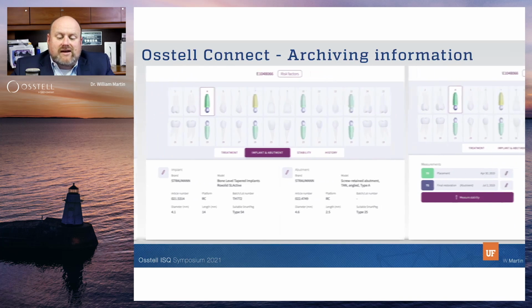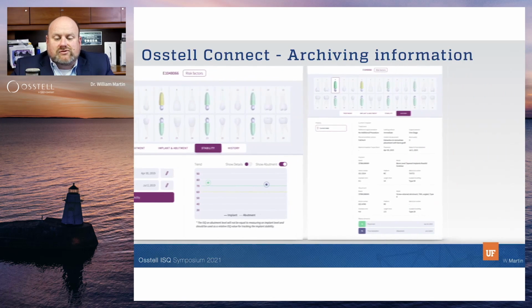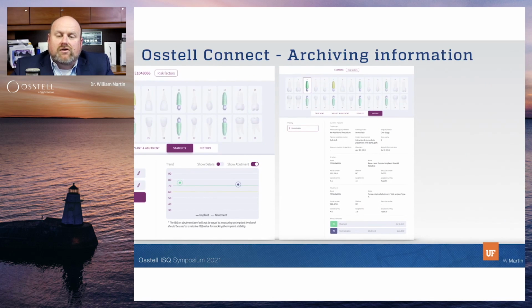We also have the stability measurements. So you could see the placement measurement, the restoration measurement, and you can actually see how they plot out on the stability table. And then we can move forward to the overall history of that particular implant. That's all tied to that information. This is just a wealth of information.